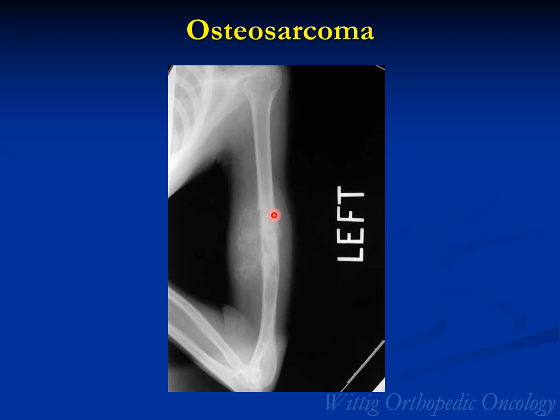Here's an osteosarcoma of the humerus with fluffy cloud-like ossification in the soft tissue component. Osteosarcomas rarely occur in the diaphysis. Only about 10% of them occur in the diaphysis. However, looking at this X-ray, you would say this is a permeative lesion, which would mean likely malignant, and there's a soft tissue mass. And the soft tissue mass is producing bone. There is ossification. So despite this being a rare site, you should be able to place this in a category of likely being an osteosarcoma.